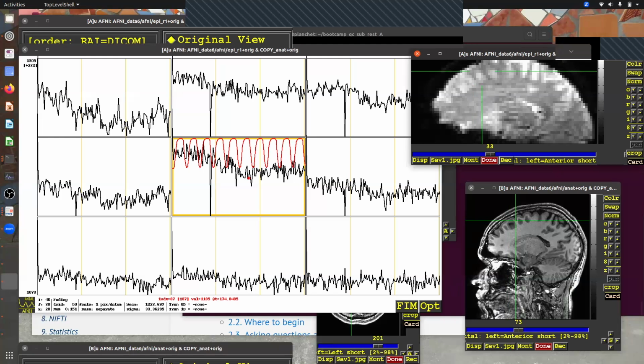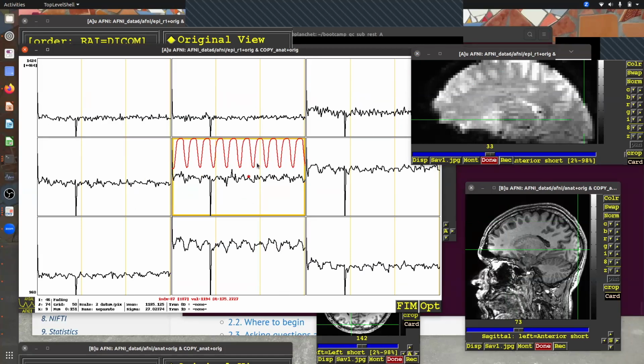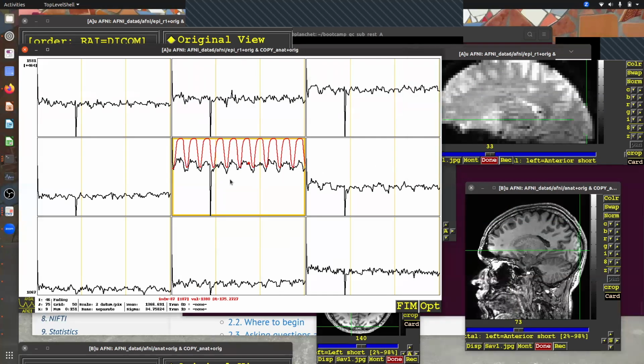So anyways, essentially what we're trying to do with our analysis and our processing is get at this question: what parts of the brain look a lot like the time series we gave? And we want to avoid features that are kind of non-physiological and noisy, like this spike, right? If we just do simple time series correlation between one of these time series and this red curve, this spike is a major feature that would throw off our measurement. It would disrupt the correlation that we want, or the regression that we want.